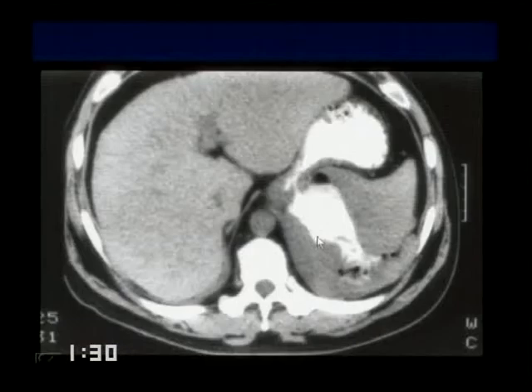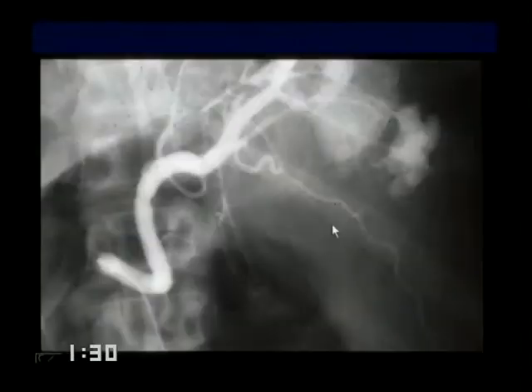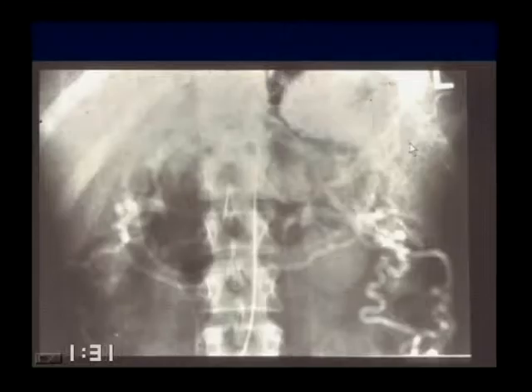And this is a rare complication with actual fistulization due to lymphomatous involvement to the stomach, where the oral contrast from the stomach is actually getting through a fistula into the spleen. This is the same case that went to angiography, and you see a blush due to bleeding due to that involvement. And here's a patient with lymphoma complicated by splenic vein thrombosis, a late phase from an angiogram showing extensive collaterals secondary to the splenic vein thrombosis.